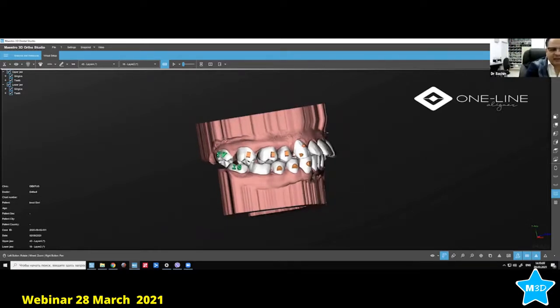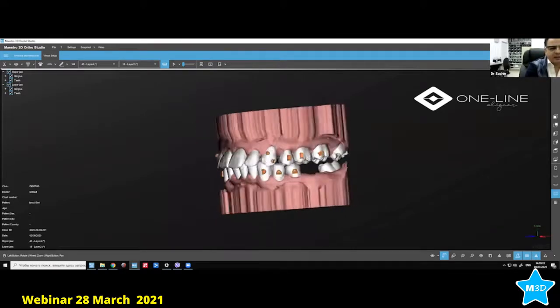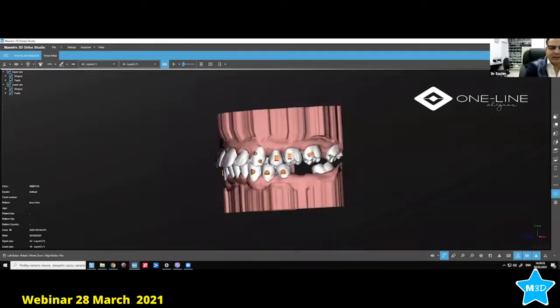And I have not completely finished this. You see that I've left the space in the first plan because I'm not sure if it's going to work out the same way. So I have just let it be here. And then I will plan the next to see the movements, what has happened in the mouth, right?